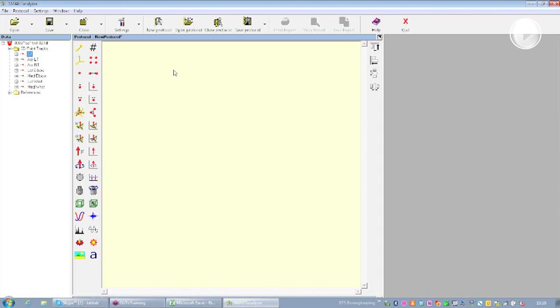So it's better, as a safety procedure, to interpolate the track, because this time the acquisition was performed well and we do not have any lack of data inside the track of the markers. But in case there are some problems with reflections or something like that that make us miss some positions of the marker during the acquisition, of course it is important to have it completely interpolated in order not to lose any information. Now we are going to do it over all the markers.